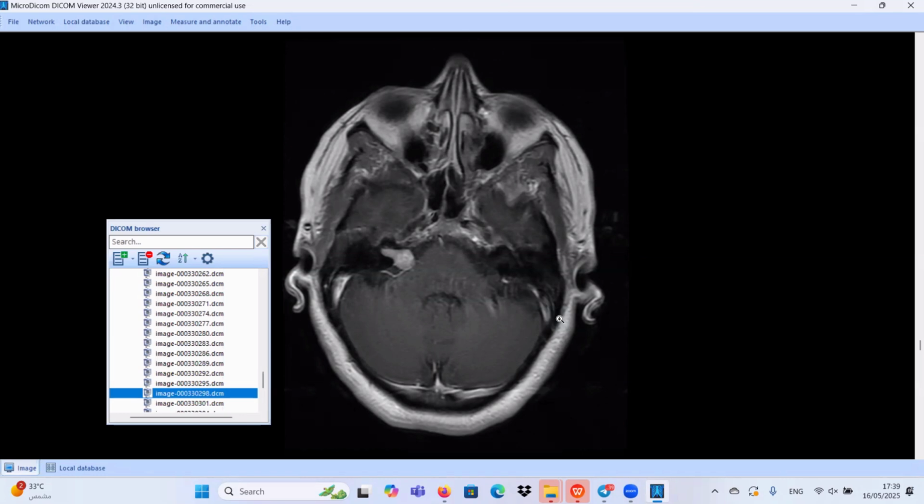Also, it can show some osteoid matrix, but we didn't have any of these findings. But for any expansile lytic lesion, if you suspect an aneurysmal bone cyst or, at the extremity, an enchondroma, you should think also of telangiectatic osteosarcoma.